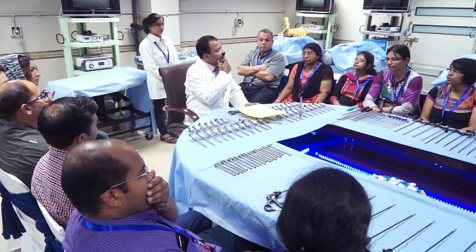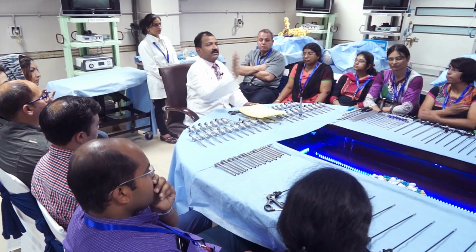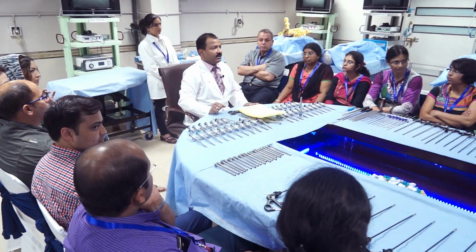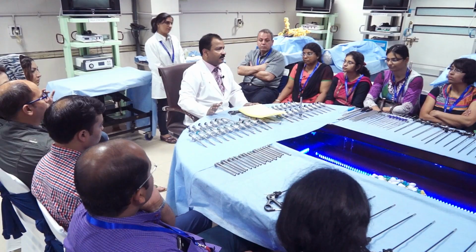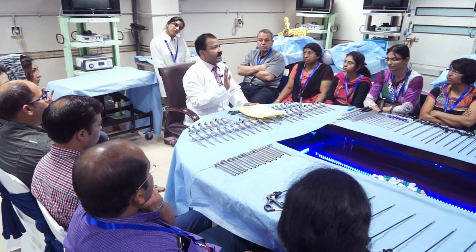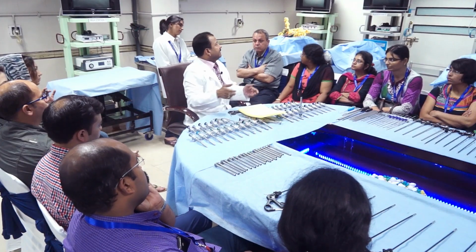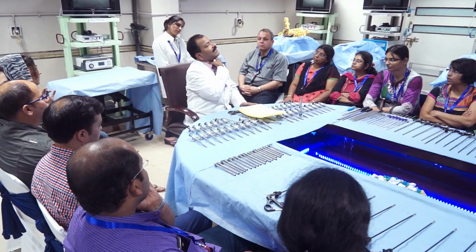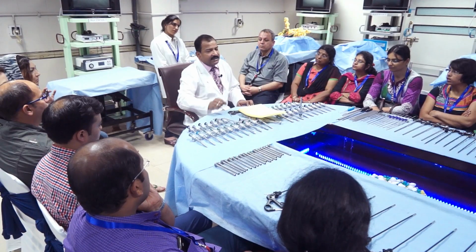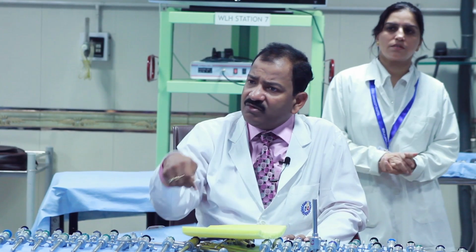Up to 15 degrees is okay. Suppose this is coaxial; that is why he is keeping the camera exactly in front of me for coaxial. But suppose I am looking up to here, then it is okay, up to 15 degrees is fine. But suppose I keep the monitor here and then I am performing the surgery, my sternocleidomastoid muscle has a stretch, and as soon as it has a stretch, your performance has to be bad. You cannot do the work the same way.